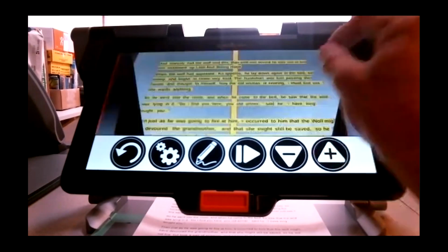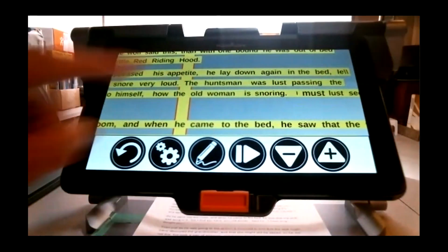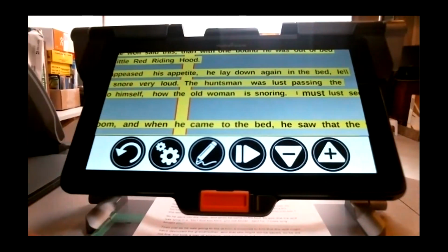Okay. So there are two kinds of swipes in this mode, on the side and horizontally. On the side, we'll switch contrast, and horizontally, we'll increase or decrease the rate of reading, the reading speed, sorry. But there's also going to be another gesture which I'll show you when the distance camera is activated. We'll come back to that very soon.